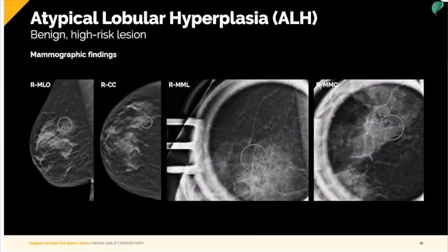This was a case where the radiologist saw a new suspicious amorphous group of calcifications. The recommendation was for stereotactic biopsy, or guidance under mammography, and the calcifications were seen in the upper outer quadrant. Here you can see. The patient was referred to the surgical team for a lumpectomy of the area. After the lumpectomy, the patient would return to their normal screening schedule as long as the specimen was not upgraded to a ductal carcinoma in situ, or DCIS, after excision.